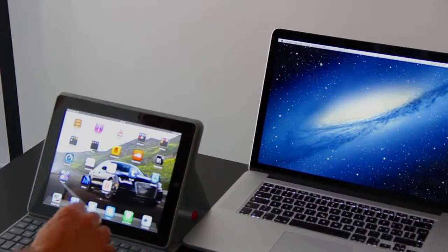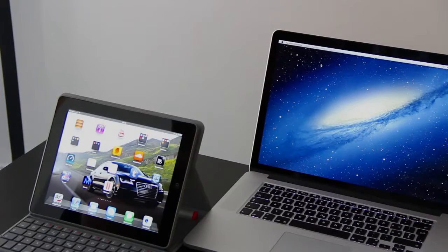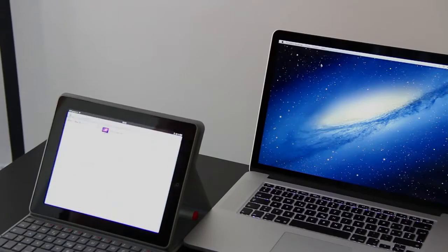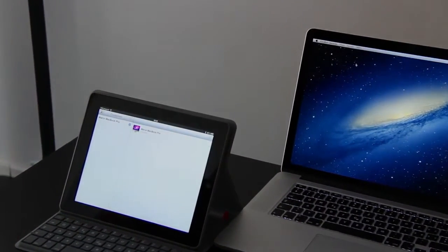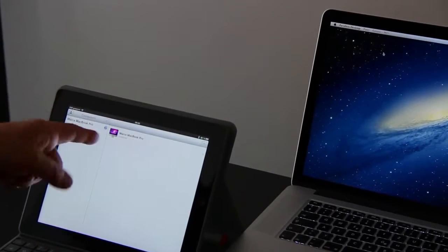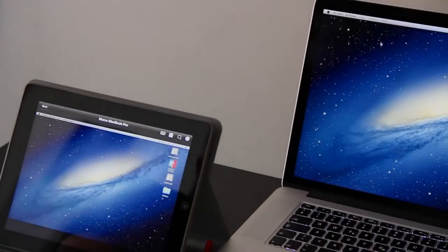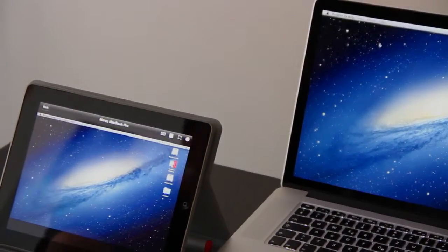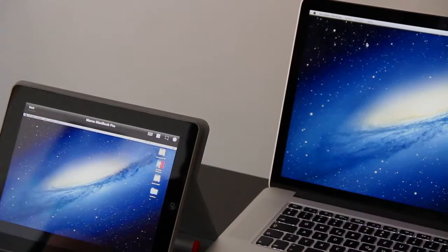What we need to then do is go to the iPad, which can be in a totally different location, running across the same network. That's very important. So we click on Parallels. As soon as we do, we can log in and everything. I've already done that. So what we need to do is connect to the MacBook Pro that's listed on our virtual machines. So we just connect there, and we can see the desktop running on the MacBook Pro, anywhere else on the same network, in another lab or in another room.